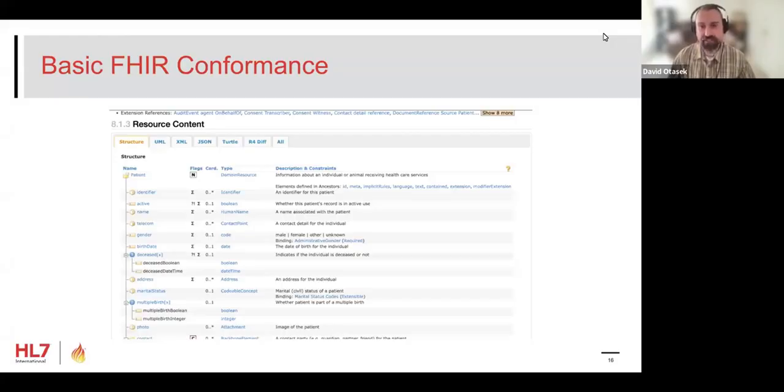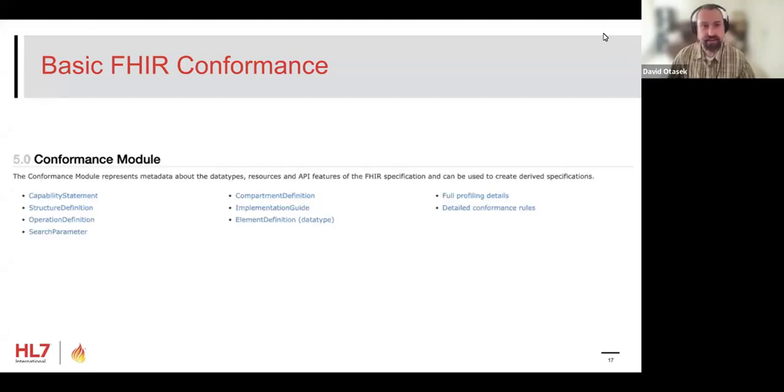Fortunately, the FHIR specification is designed in such a way that you don't have to do this manually. It contains conformance resources, such as structured definitions and implementation guides, which can be used to logically check for conformance to the specification by an application. The validation code in the core Java project implements this validation logic.